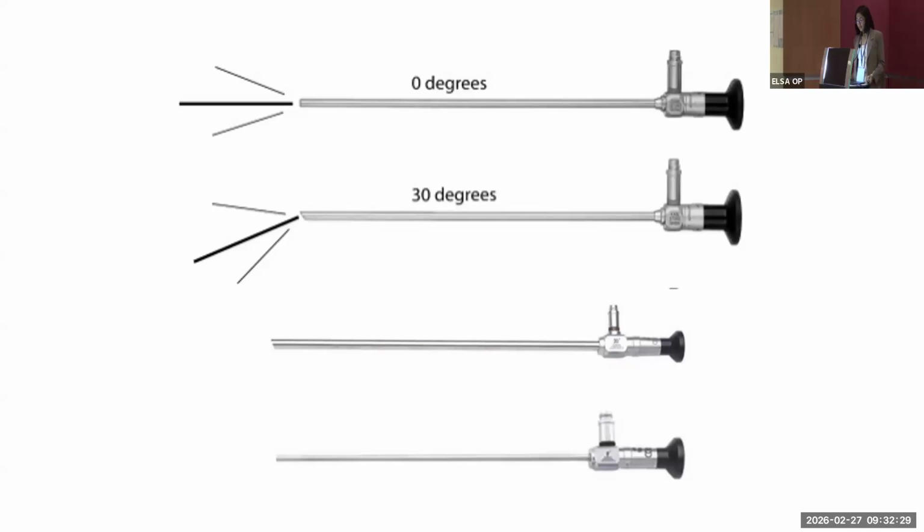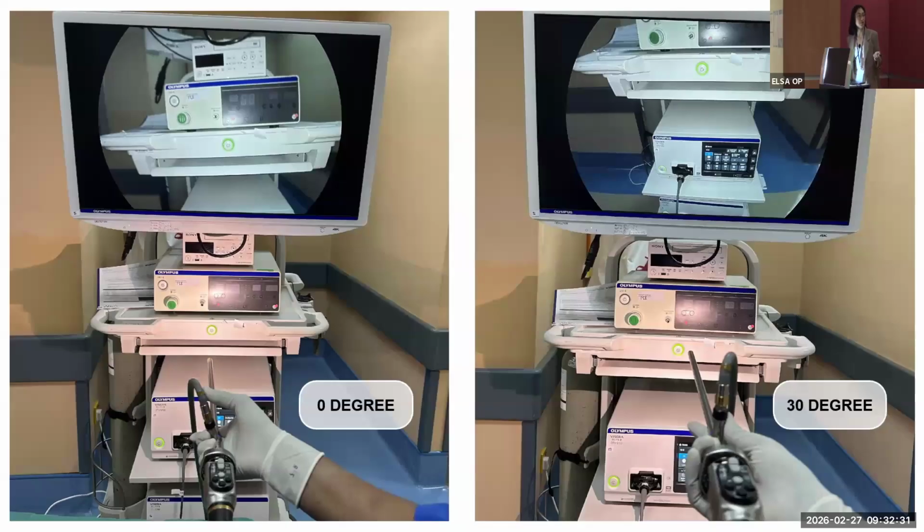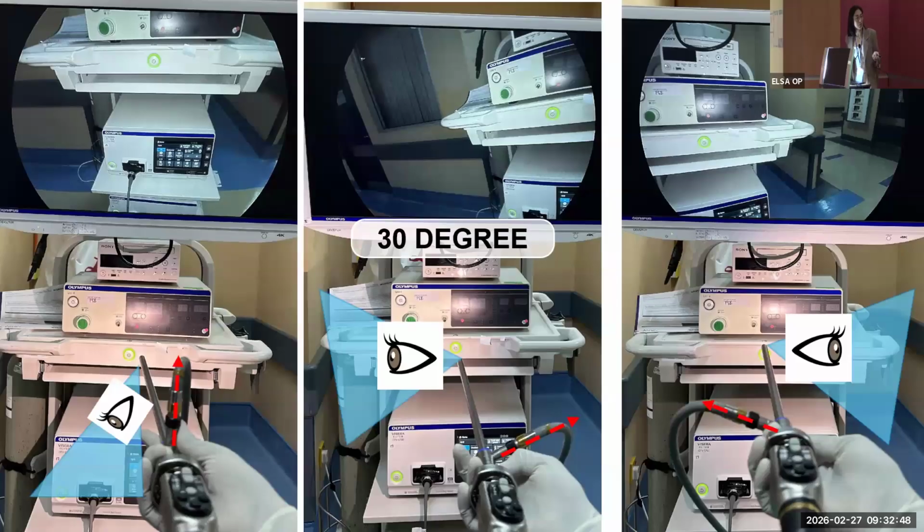Okay. So here's just an example of how you would see images through the different types of telescopes. So for 0 degree, you'll see it like a flat image, how it is. In a 30 degree, you'll see it in an angle. So for the 30-degree, to be able to use it properly, you should be able to move the light stick. So when you move the light stick to the right, you will see the left. It's the same with the opposite side. So when you move the light stick to the left, you will see the right side.